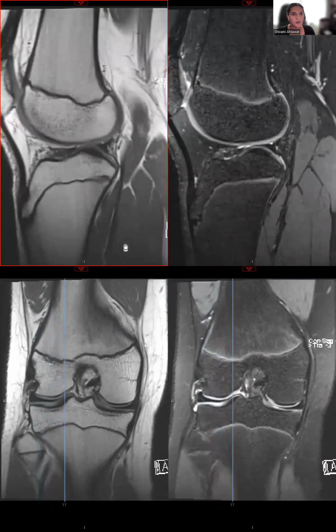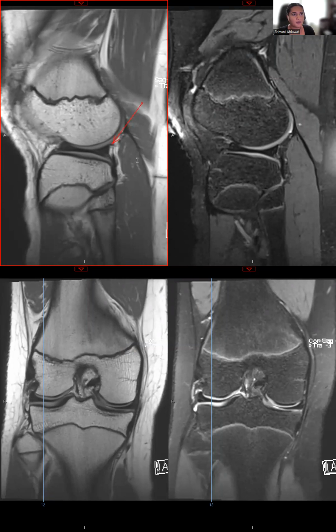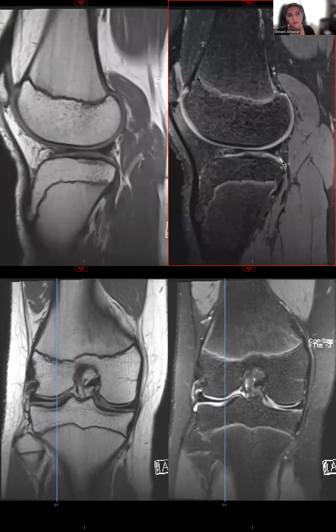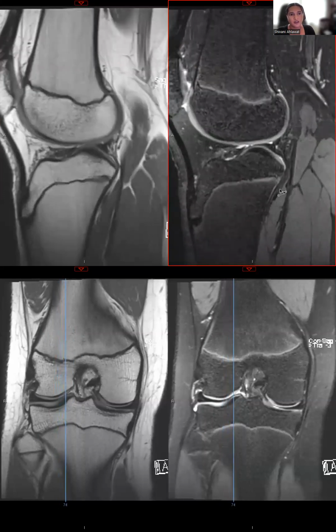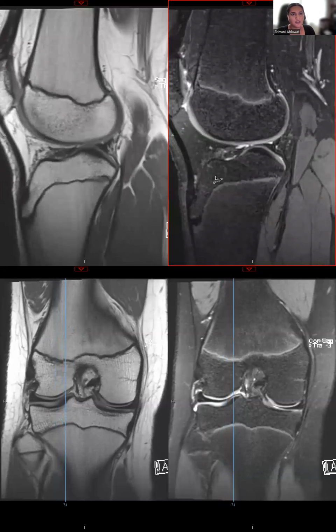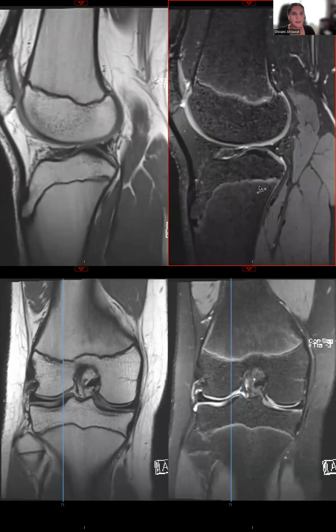This is another person, and we'll be scrutinizing this person's lateral meniscus. What I want you to notice here is, as I pointed out previously, you can see on the sagittal sequence the posterior superior and inferior popliteal meniscal fascicles. Sometimes the posterior inferior fascicle can simulate a tear, as maybe you could possibly think of this as being a tear, but it doesn't definitely connect to the inferior articular surface. Be careful: if you're a little bit hedgy or unsure, or it doesn't connect on two contiguous slices, then our accuracy does decline. The other thing I want you to notice here is the anterior root attachment has this sort of split appearance, and there can be this horizontal split appearance of the lateral meniscus anterior root attachment, and that's also a normal variant.